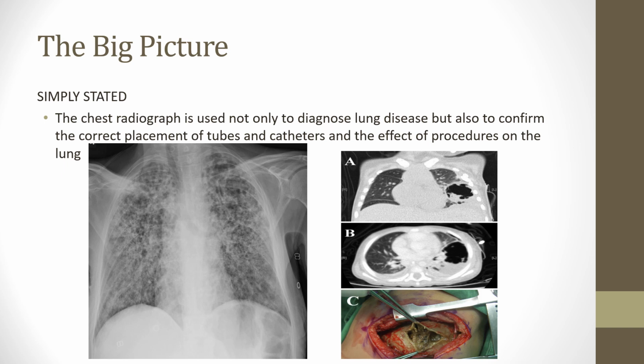So the big picture, right? The chest x-ray is not only to diagnose disease, but to confirm placement of tubes, catheters, and how procedures are working on the patient's lungs. So there are so many diverse applications that make x-rays so important. The more you play with these, the more you evaluate, the better you'll get at it too.